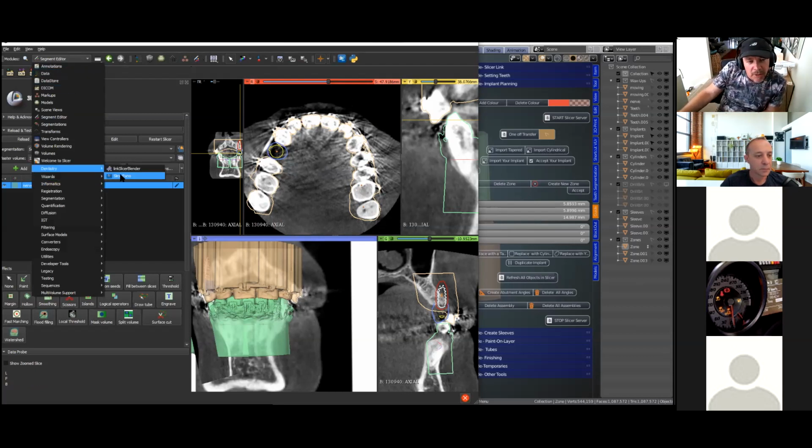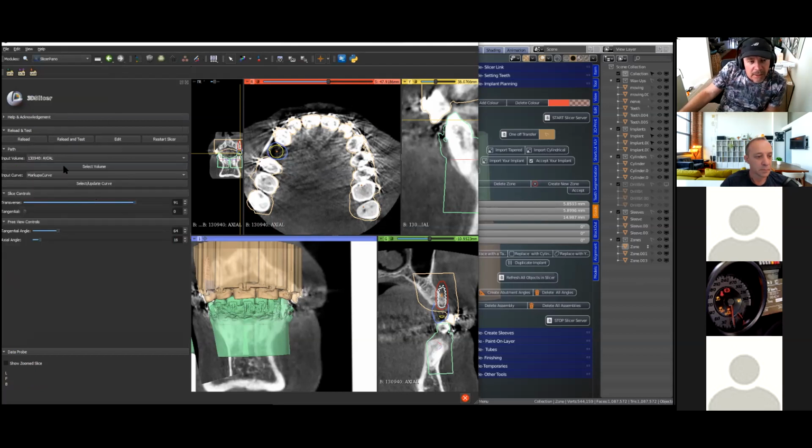So I'm going to go to the panel again, and in this curve we're going to click create new markups curve, and then click on this one, and then we'll make another drawing like that, and then from there we're going to select it and update it.